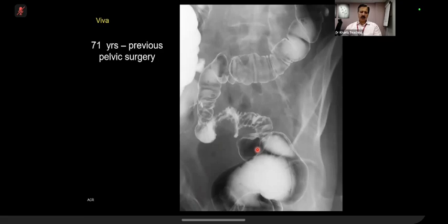Many times it has come in the exam, and a similar case will also come in MR, where there is metastasis sitting here, and this is a case of ovarian carcinoma which has recurred. And what happens when metastasis sits close to the rectosigmoid junction is the same phenomenon which we saw on the pancreatic carcinoma film.